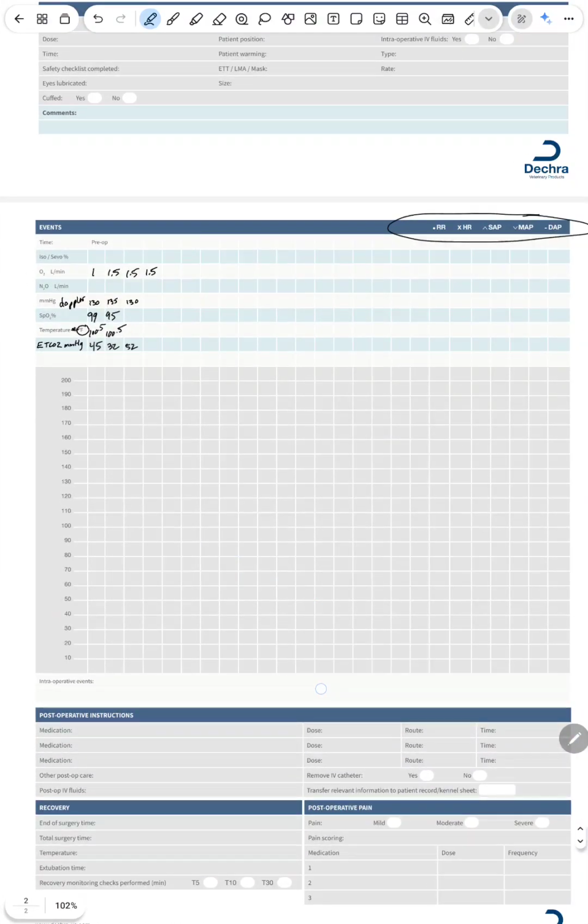And now we go over to our grid. So systolic, this is going to be a change from what you've seen, is going to have that caret pointing to the number closest to where I can get the tip of that caret. And let's say you're trying to make the argument, I can't possibly show the difference between 142 systolic and 143 systolic on this grid. And I agree with you, you really can't.